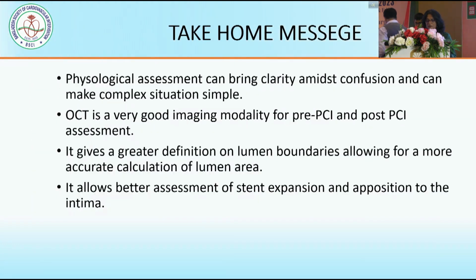So my take-home message here is that physiological assessment can bring clarity amidst confusion and can make complex situations simple. OCT is a good imaging modality for pre-PCI and post-PCI assessment. It gives greater definition on lumen boundaries and allows for a more accurate calculation of the lumen area. It allows for a better assessment of the stent expansion and apposition to the intima.